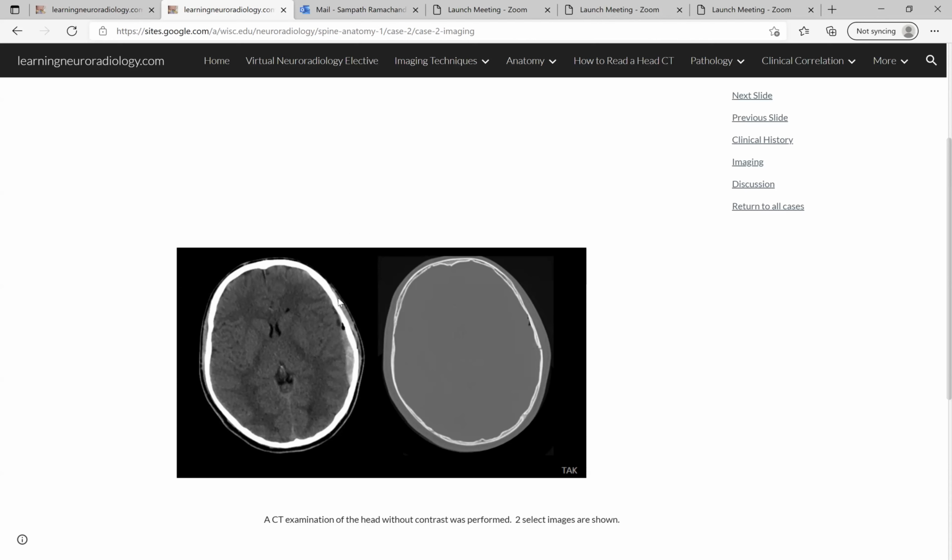So if you think about spaces in the brain, the epidural space is the space that exists between your brain surface and the calvarium. There is this covering of your brain called the dura mater, which sits right between the calvarium and the brain. And so this is the bleed that occurs right between the two. And this has a typical shape, which we call lentiform shape. Just from the shape alone, you can tell this is actually an epidural hemorrhage.